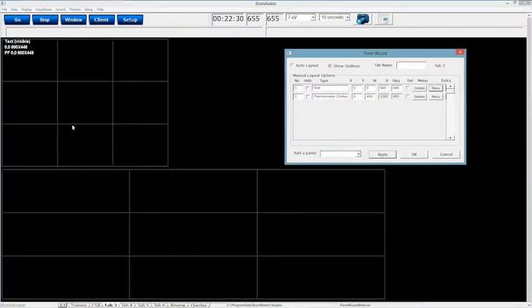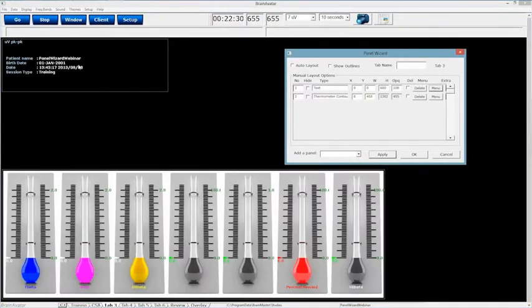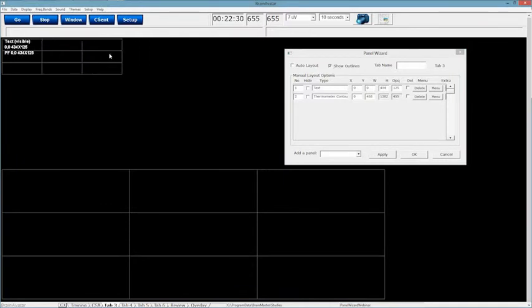I'm going to show my outlines. I'm going to move this up a little bit. And now I'm going to fine tune it. There we go. So now I've fine-tuned it so that basically this tab is going to display my patient information right off the bat. Fine-tune it a little bit more.